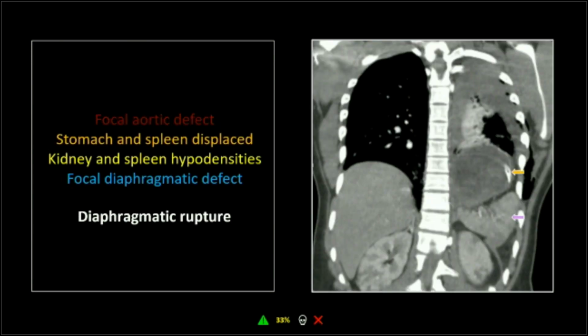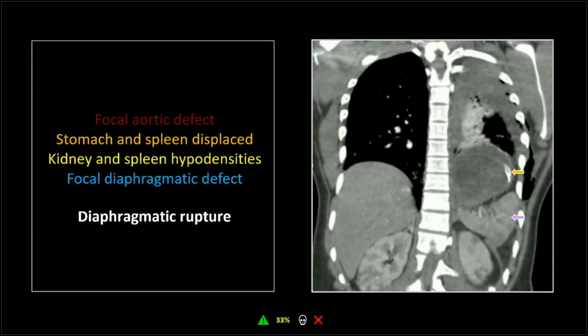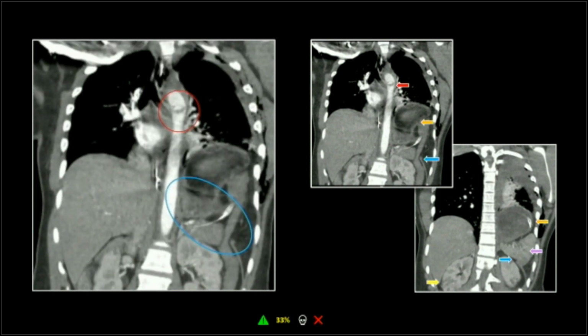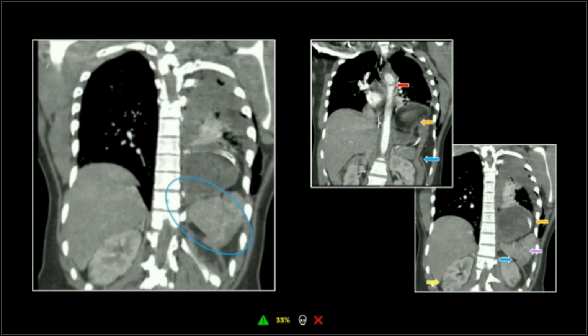And look at that. When I first looked at this, I said, oh, his spleen is upside down. But actually it's not. It's rotated about 90 degrees though. I went and looked at all the other planes and it's not quite upside down. But it's pretty neat that you can see it's sitting above the remaining leaf there of the left hemidiaphragm. And look at those kidneys. You really can appreciate those peripheral wedge-shaped microembolic injuries right there. That's one looking at. You can actually see the defect in the diaphragm, the stomach and colon going up through it, and the upside down spleen.